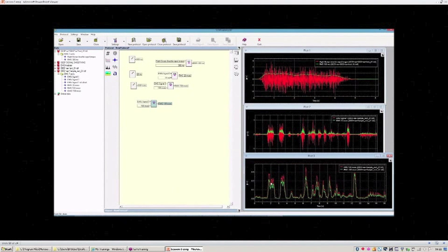So we got a signal with a similar shape, with the same shape, but the integration reduces the amplitude of the signal more than the root mean square algorithm. So this is also why it is the preferred algorithm to perform the smoothing or the computation of the envelope of the signal.